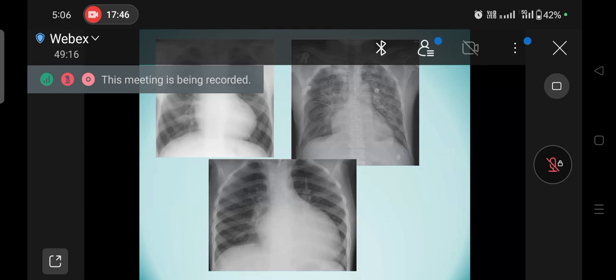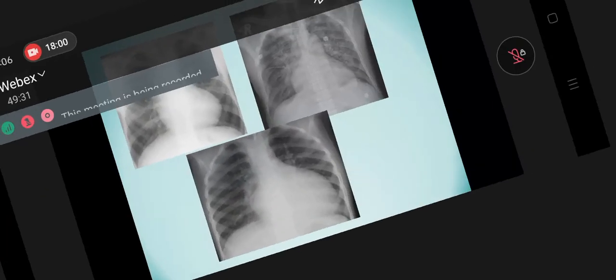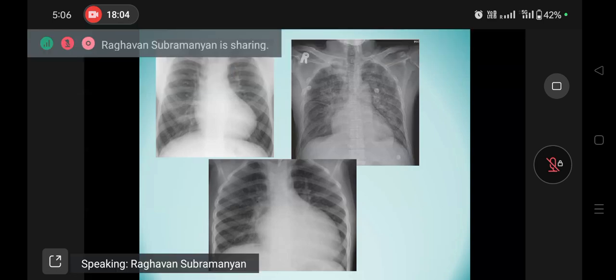Okay, but generally an upturned apex indicates a high likelihood of right ventricular enlargement. A downturned apex indicates a high probability of left ventricular enlargement. Occasionally you see a combination. You see this apex is also pointing downward, but it's also lifted up from the apex. A combination of down and out as well as lifted up, and therefore it's quite difficult to describe this as an upturned apex or a downturned apex.